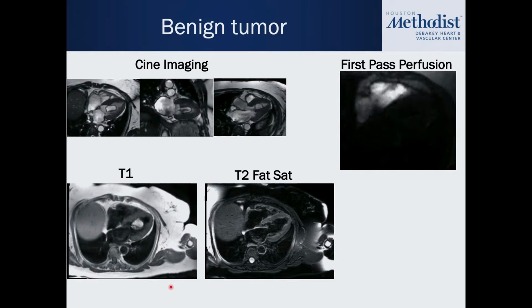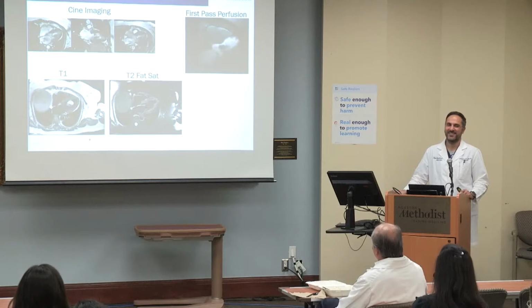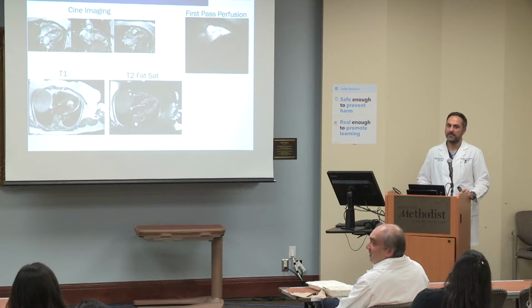Low signal, right? No, high signal. Nobody's saying anything. Right? So there's a high signal on T1, right? What does that mean?